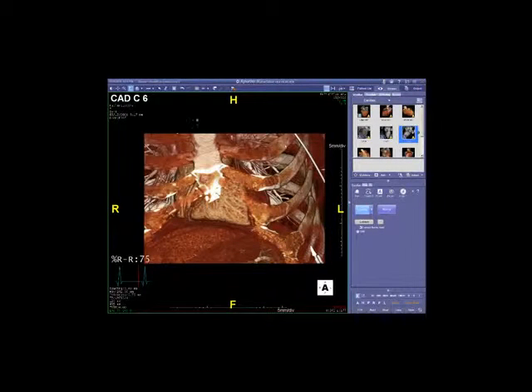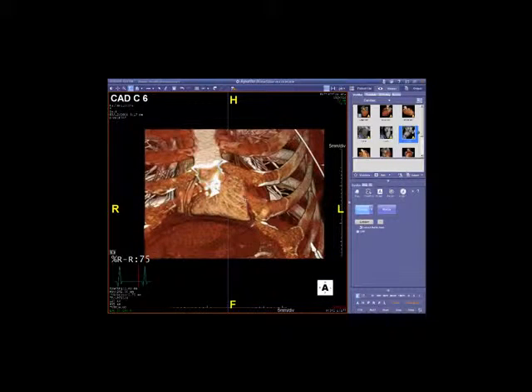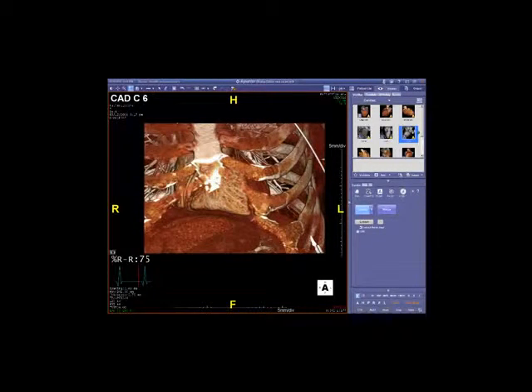And we'll start with our first case here. The cases we're reviewing today are actually bread and butter cases that are out of our clinic. So these are real patients that we've taken care of where CT angiography has been helpful in the diagnosis.